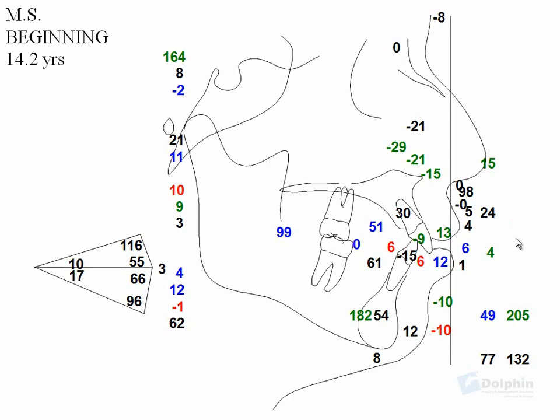And from that we get a lot of soft tissue information as well as some additional skeletal information. In particular, the occlusal plane is recorded here as 99 degrees. It is based on a line through the maxillary occlusal plane and the angle that it forms with the true vertical line dropped through subnasale.